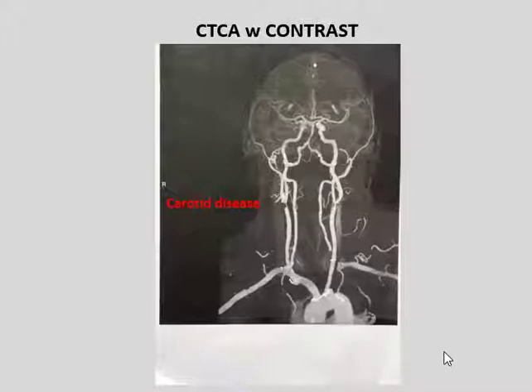Quick question, can you tell whether the patient is facing us or facing away from us, and what clues would you use?